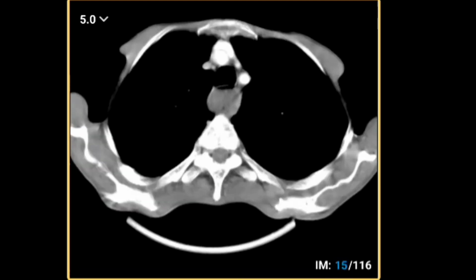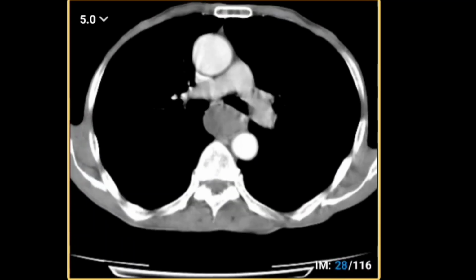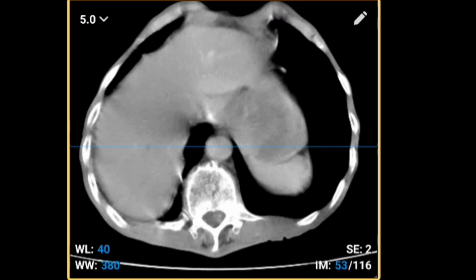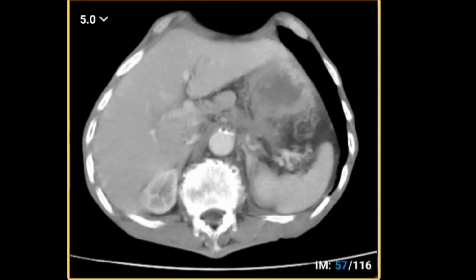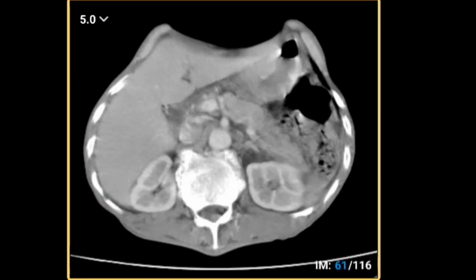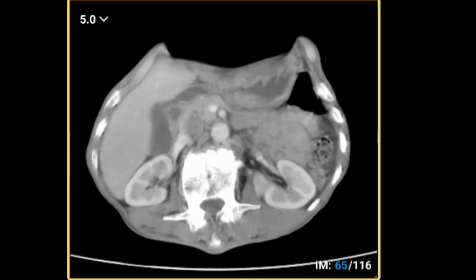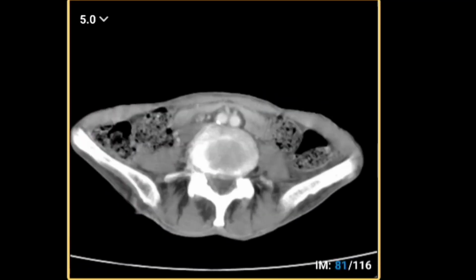So this is pulmonary metastasis secondary to gastric carcinoma, which is extending all the way from the esophagus into the stomach, involving the gastroesophageal junction and giving the stomach the configuration of linitis plastica without any metastatic deposit. If you look at the stomach or anterior abdominal wall, it gives a scaphoid abdomen, a scaphoid presentation. So this is gastric carcinoma with pulmonary metastasis.